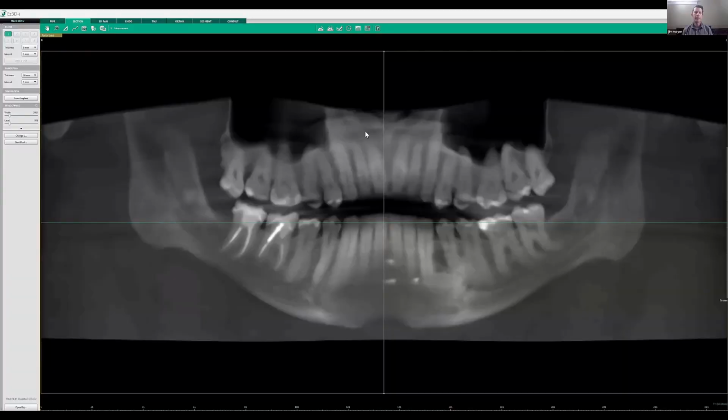Okay. So let's go ahead and look at those two screenshots. You brought up the software here. Let's go ahead and look at this within the imaging software. Mm-hmm. So I thought we'd look at this case and go through the scan to emphasize the importance of looking at the lesion from multiple dimensions.